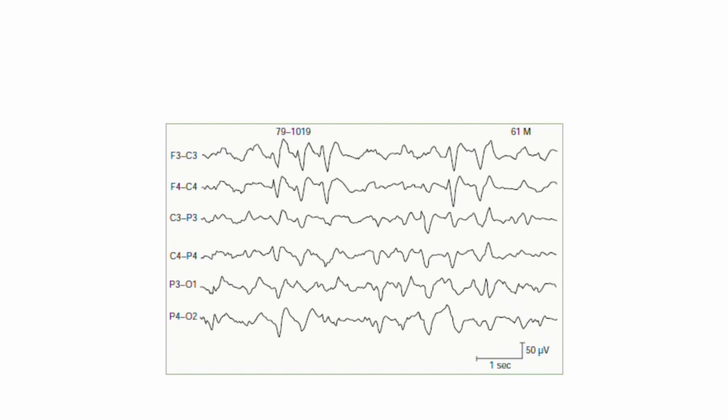1. Morphology of a triphasic wave. If you isolate a single complex within this burst, you can trace three distinct phases that give the waveform its name. Phase 1, initial negative, a small, brief upward, negative deflection. Phase 2, main positive, a prominent, high-voltage downward, positive deflection. This is the dominant component of the complex. Phase 3, subsequent negative, a slower, upward, negative deflection that often tapers off into a slow wave.